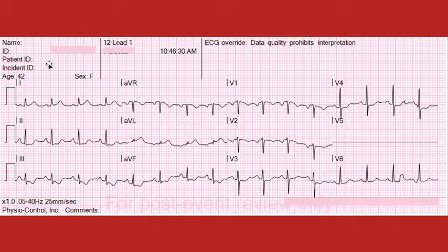Despite the fact that V5 is missing, it looks as though V3 shows maximal ST depression. And then over here in the frontal plane, it looks as though lead 3 is showing maximal ST segment depression. So that should cause us to take pause and say this is most likely not generic subendocardial ischemia of acute supply-demand mismatch, but rather this is focal to a primary injury.